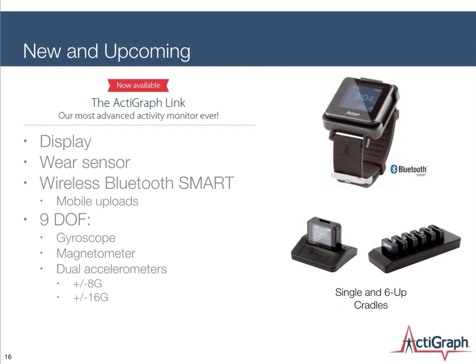I did want to also mention the cradles. We've had many requests for help to connect this to the computer in an easier way. We have done that with this device, providing a cradle to just drop the device into, and a 6-up cradle that allows you to connect up to 6 devices for simultaneous charging and upload.